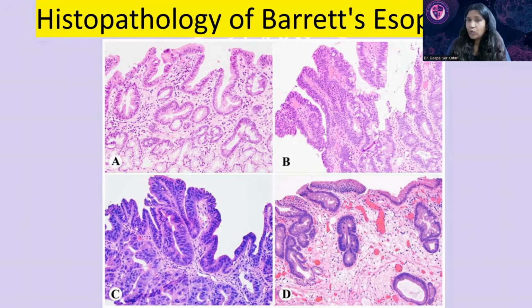Don't report it as low grade. If you have some small basal atypia here and there, you should still call it negative for dysplasia. If the NC ratio is normal, a low nuclear cytoplasmic ratio is seen, no stratification, not much atypia, call it negative. And there should not be any hyperchromasia anywhere. There should be no pleomorphism, and architectural distortion should be definitely absent for you to call negative for dysplasia.